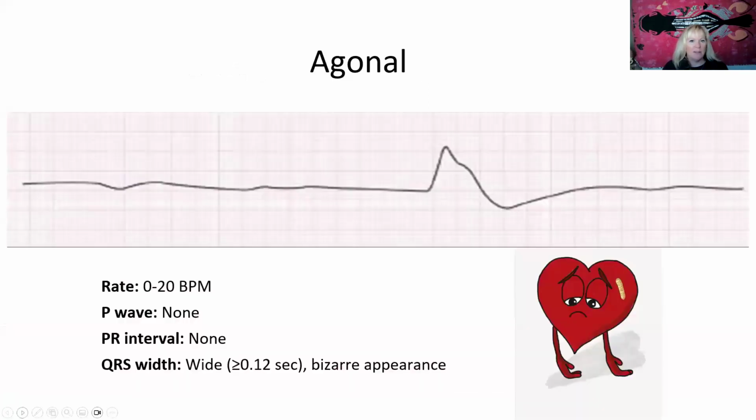Then getting into the agonal rhythm, this is something, again, that EMS will deal with a lot.